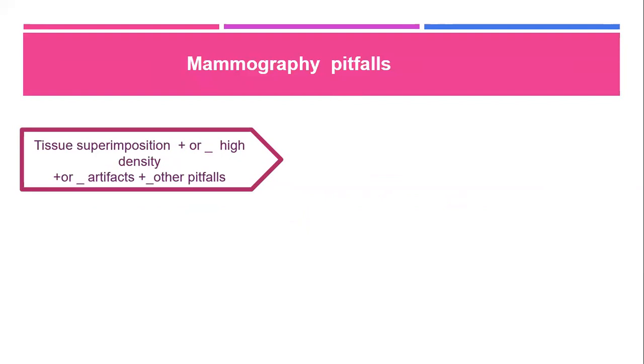Okay, so as you know, 2D mammography has a lot of limitations and pitfalls. The major limitation is tissue superimposition, okay?